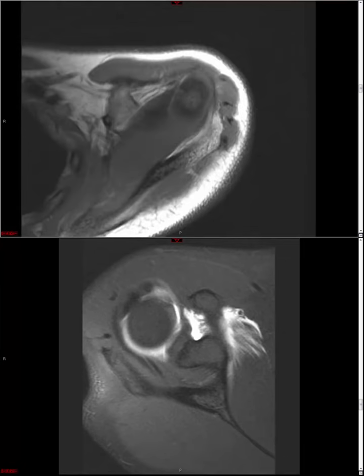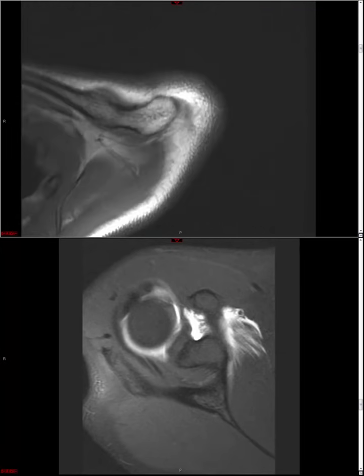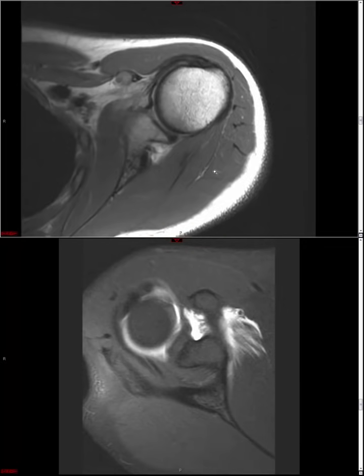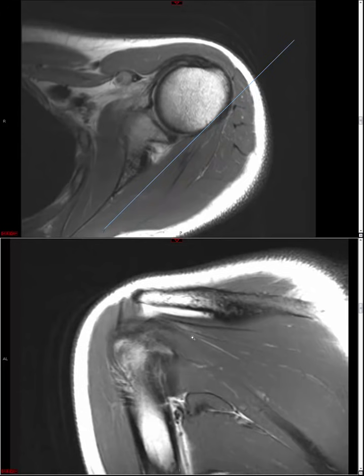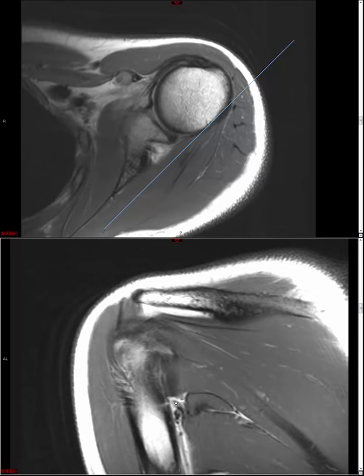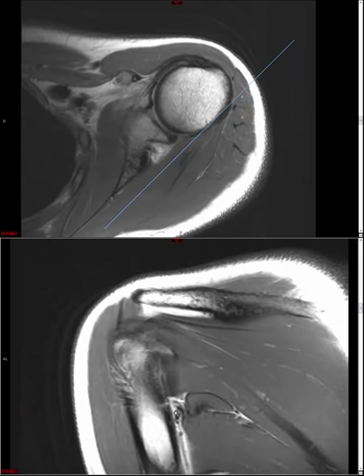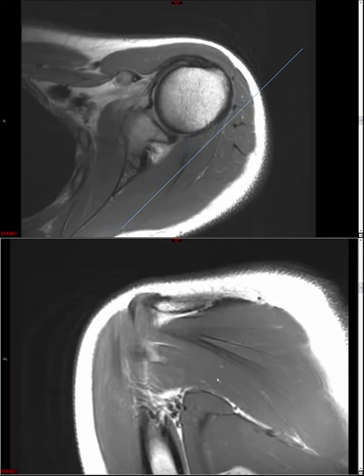We're scrolling up and down. We're once again looking for lung masses. We're looking for axillary adenopathy. We're looking for muscle abnormalities, bone or soft tissue lesions or masses, and so on and so forth. We already looked at the localizer, and I'll just mention in passing, we had talked about the suprascapular and spinoglenoid notches while we talked about labrum assessment, but you might actually also see mass lesions in the so-called quadrilateral space. In this space, we see the posterior humeral circumflex artery and the axillary nerve, and so if you see an obstructing mass lesion here, you may see selective muscle edema or atrophy involving either the teres minor or deltoid muscles.